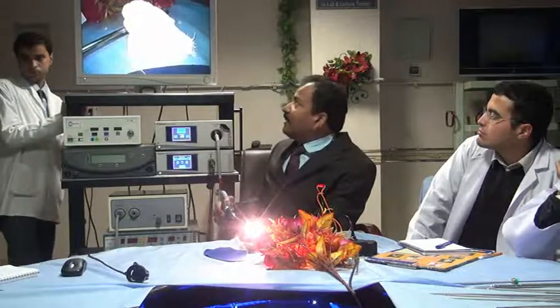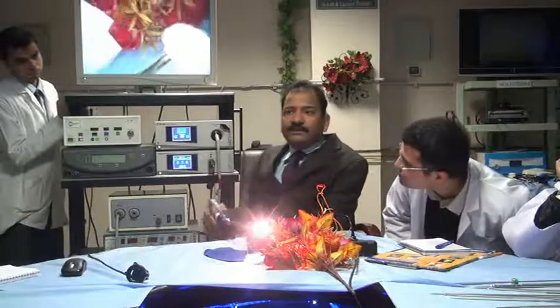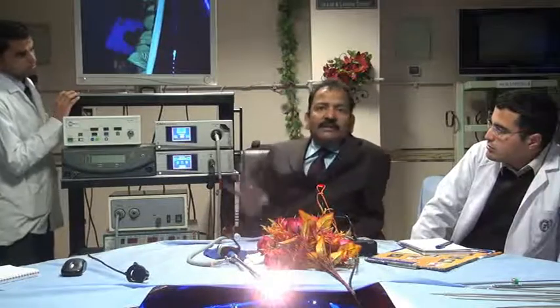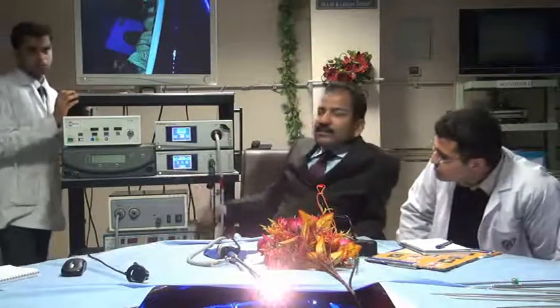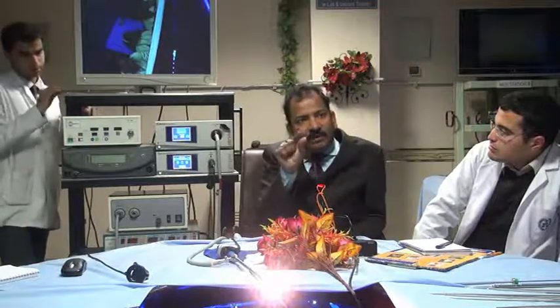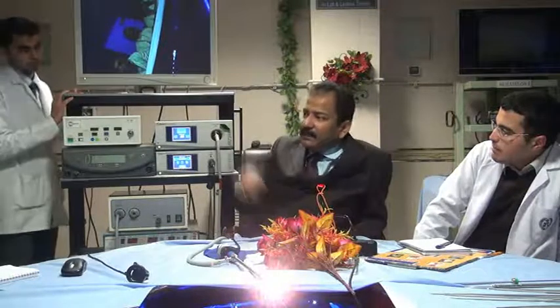Then after that you have the different types of recording. See, these are the sounds which you will get with different types of recording devices. So these are the programmable buttons which you can program according to your needs. But in most of the cameras nowadays, in HD cameras, they are writing the programming here, just like previously people were doing the equalizer settings on their own. But now the company has given different rock, jazz, disco presets, so that they don't have to keep on increasing or decreasing the whole day.